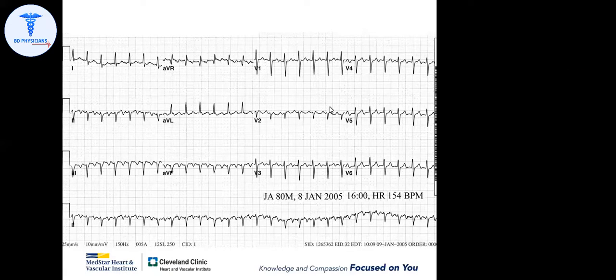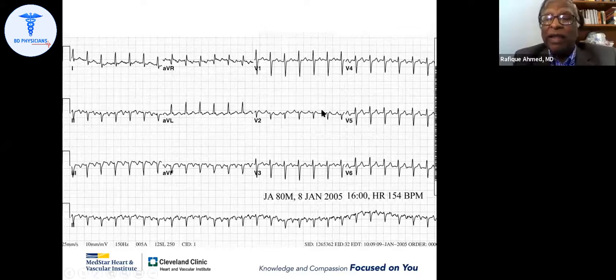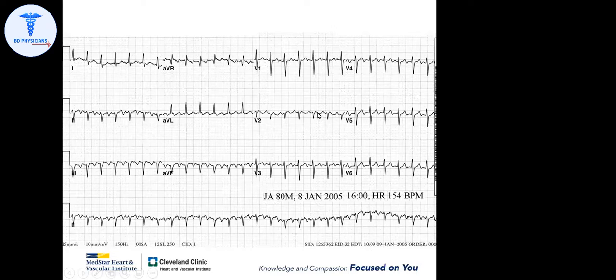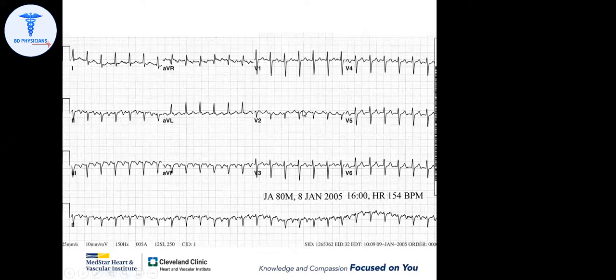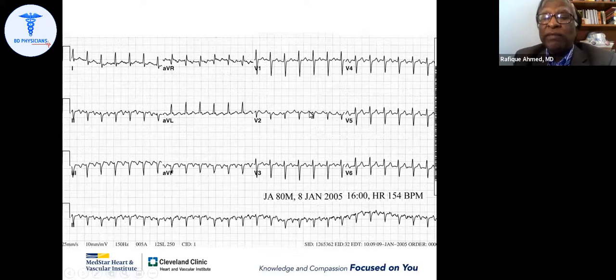Sir, another P wave, sir. Look here. Over here one, over here one. And I look in between, maybe this is a P wave. V2. Yes, sir. And then lead 3, you can see this saw, but you cannot see the second one. I am thinking this is probably, if my calculation is correct, there is a P wave before QRS, and there is one in the middle. Because normally in lead V2, you don't see anything like this. So what is the diagnosis now?